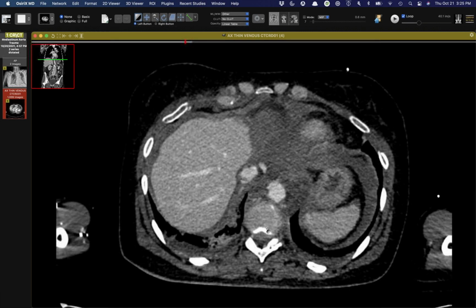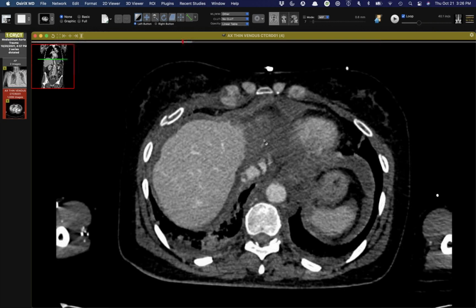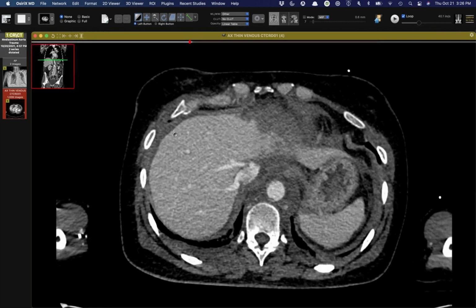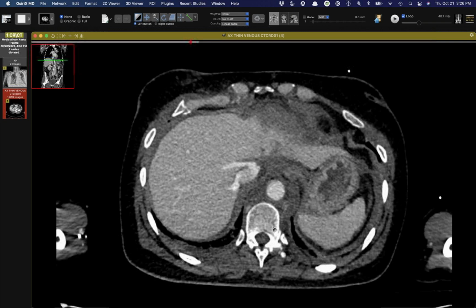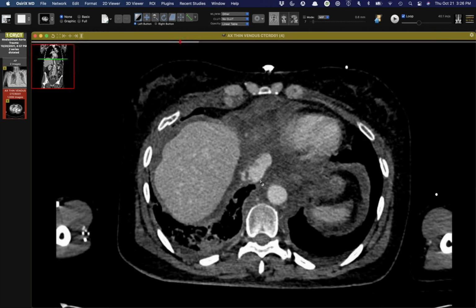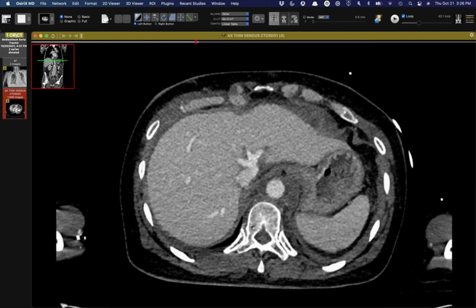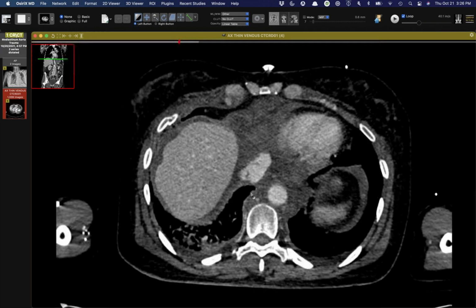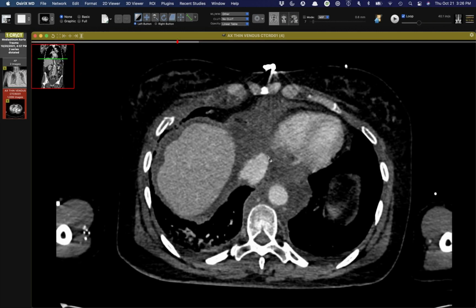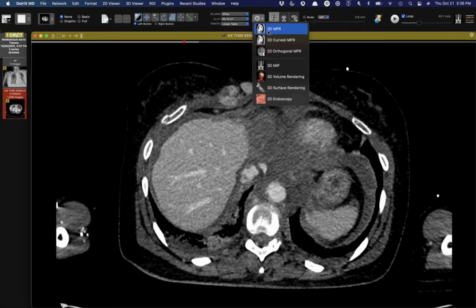But what I haven't seen before, and this is new, so we haven't had follow-up yet, and I have not actually seen this in real life, but notice all the hematoma that's around the liver. And I think this is below the diaphragm, most of this. But check out the configuration of the inferior vena cava and how there's a full-blown traumatic injury of the inferior vena cava as well. And it's peculiar because it's contained here, but I guess it's a very low pressure venous system that it hasn't, it obviously is extravasating into this area surrounding where the normal configuration of the IVC.